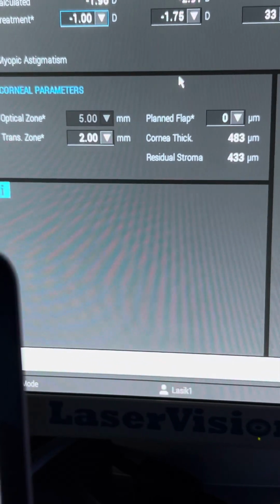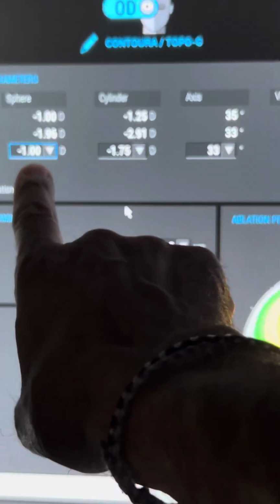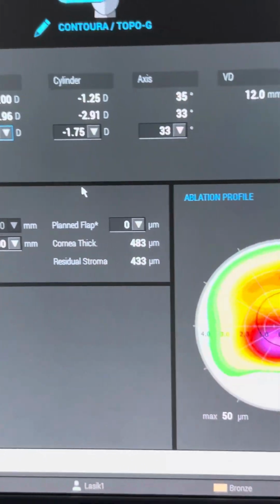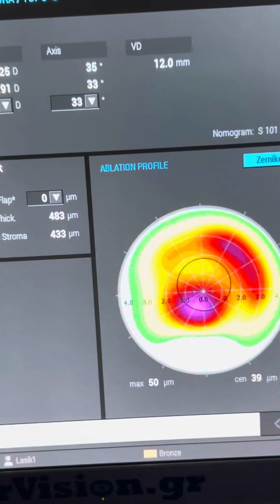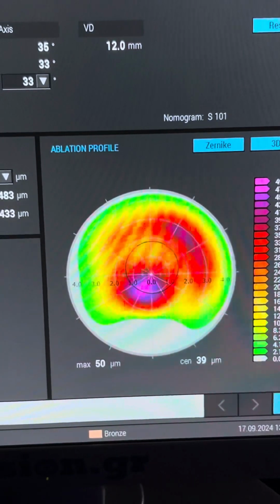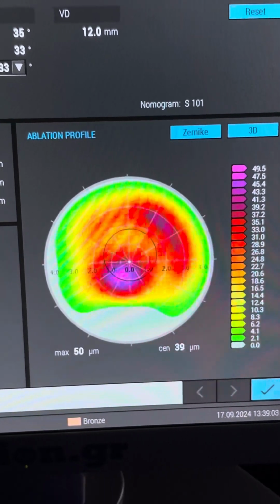And we would add to this 2.5 diopters of myopia on the Contura treatment, and then treat a wavefront optimized plus 2.5 to account for the PTK, which here will be, since outside the US we can do a PTK, we'll use the same device to do a PTK, 8mm diameter, 40 microns thickness. So this is how we designed the Athens protocol.